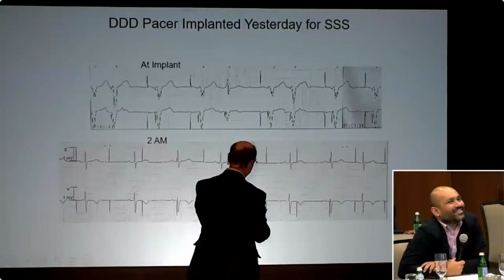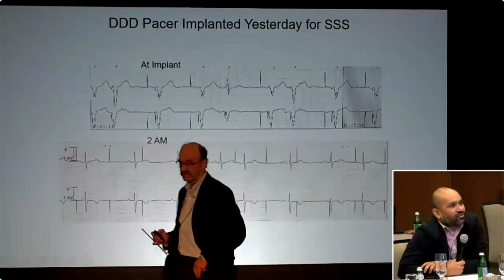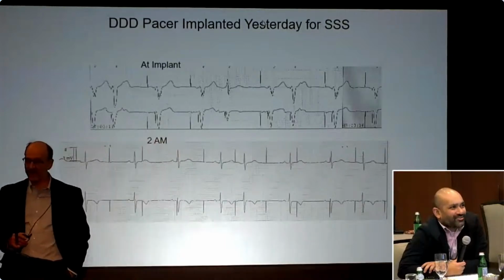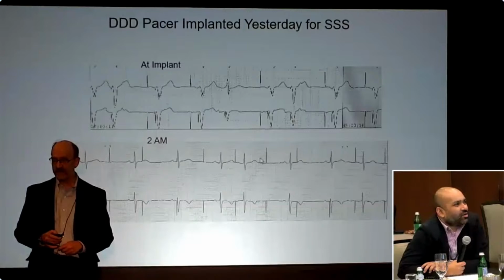I'm going to trust you, sir. I'm going to circle something up here for you. Yep, so that's where it says sick sinus syndrome was the reason it was implanted. Fair enough. Is there one beat that comes early in the middle of the bottom tracing? Yes, it's the 5th beat that ends up coming early.